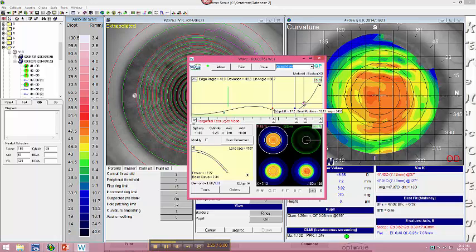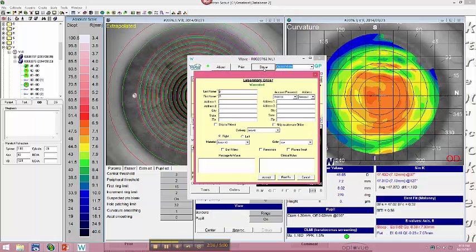a millimeter outside that. I also move the center thickness to 41, edge to 30, click the edge box with like a freeform edge, and I used RSIM. So I'm going to let it run at current settings there. I'll save it now.